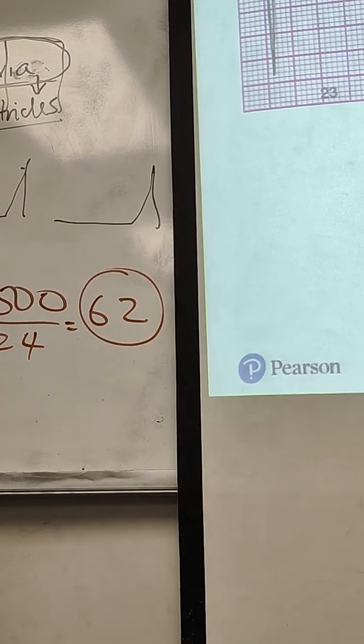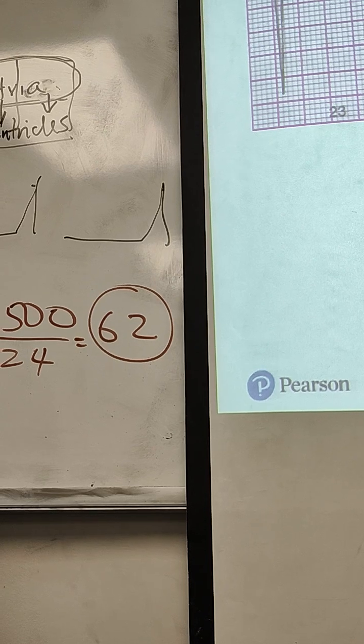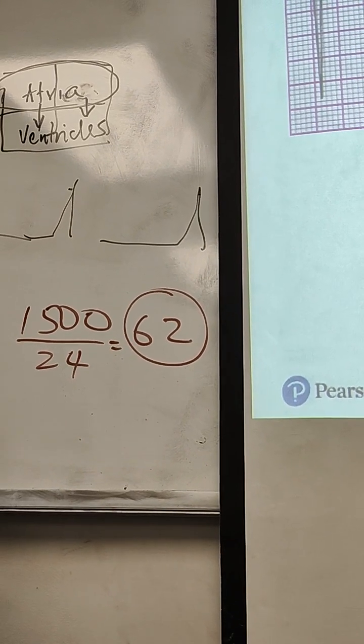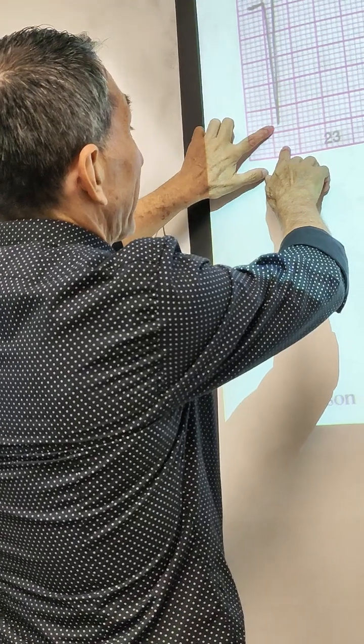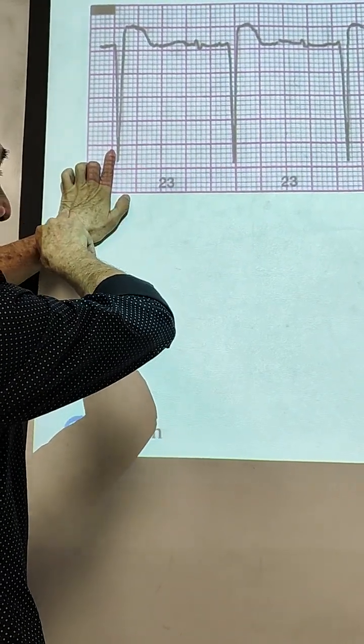I have a question. Sure. The numbers on the bottom, that's how many boxes? Yeah. Of course, in your EKG, you're not gonna have that. Because that will be a given, right? No, you have to count it. But if you really count right here, this is one block less. So I have 24 right here, not 23.